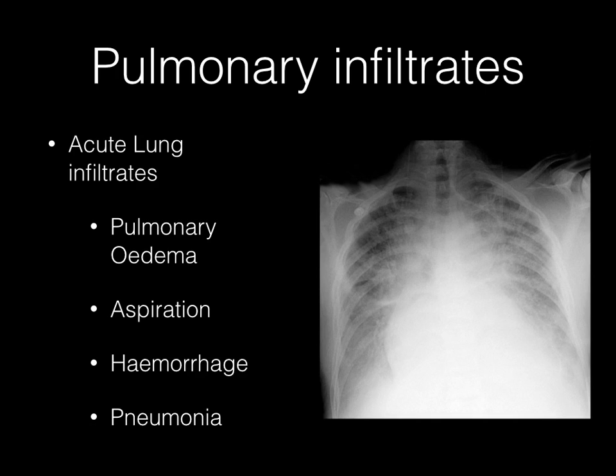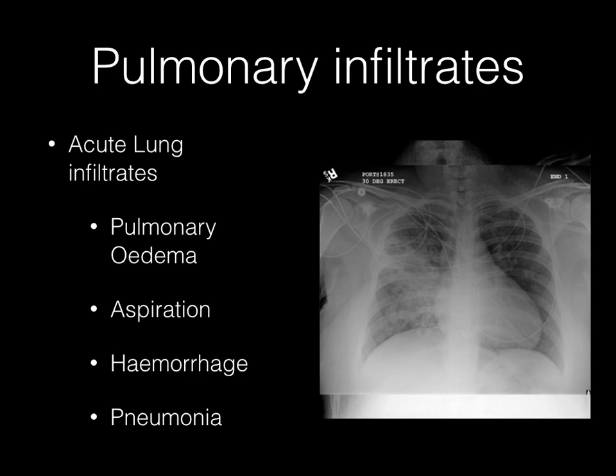Now, acute onset lung infiltrates could also be because of aspiration or even community or hospital acquired pneumonia, and these usually present on a unilateral side. Obviously, lung infiltrates would depend upon which lobe is infected or which lobe is infiltrated with infection.